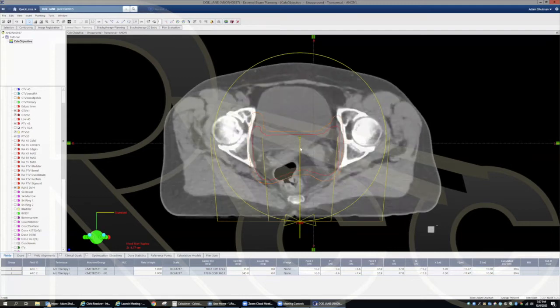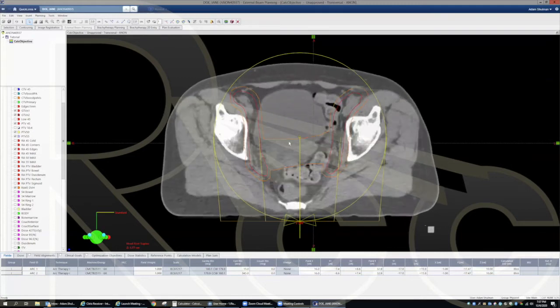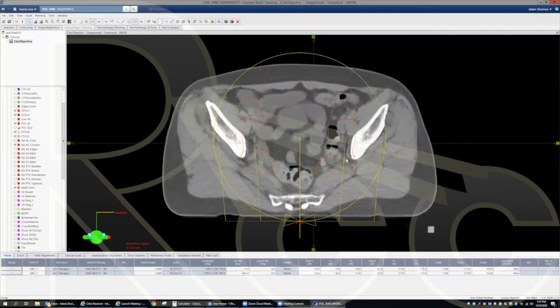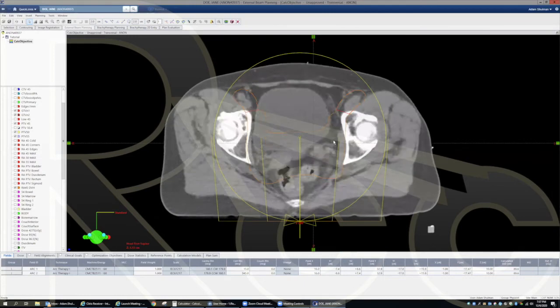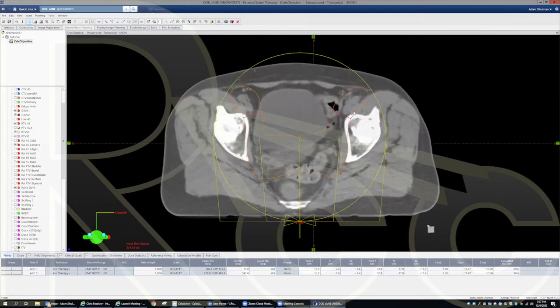The other area where it's going to struggle, these nodal chains up here, right? These are tougher areas for it to cover. Same thing with head and neck cases, the nodal chains in head and neck cases. So I always make these corners. Here they go, just the corners. Nothing else, corners front and back, corners up here, and it doesn't cover anything else. Just these little areas where I know it's going to struggle, so I can put those contours in advance.